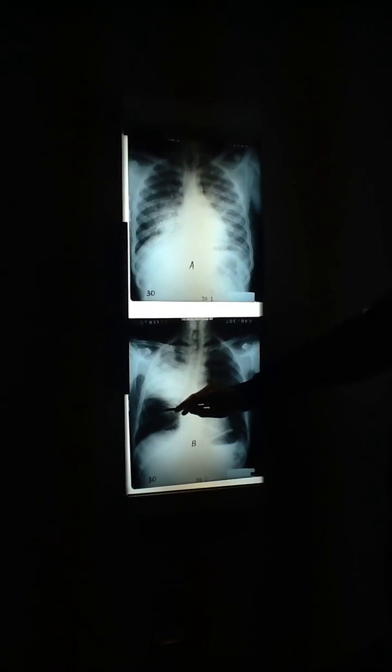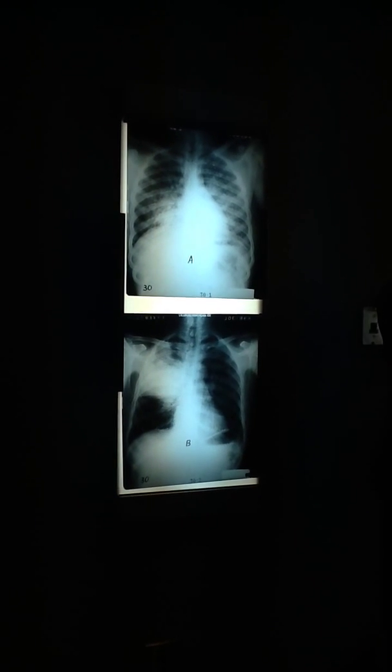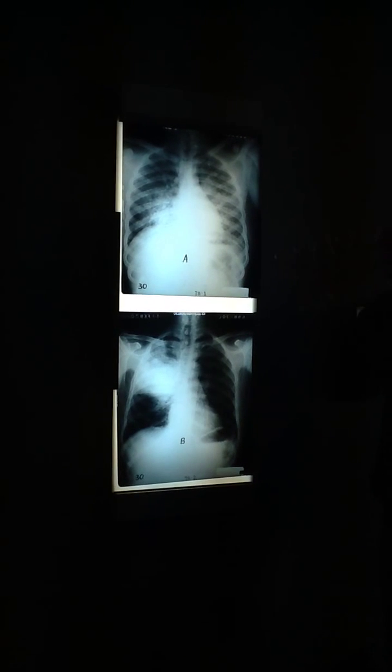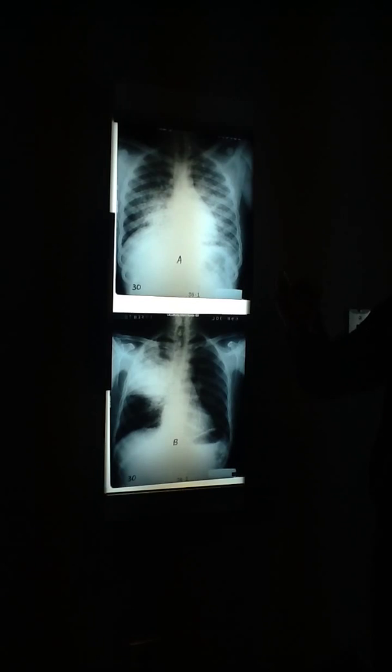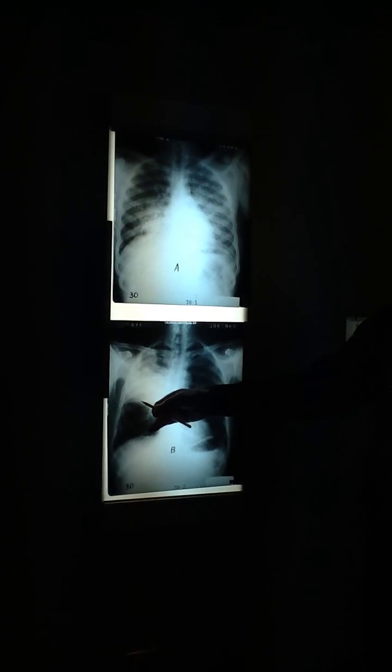All, some, none gives us a fuzzy border, doesn't it? So we have all of them filled up, then only some of them filled up, and then none of them filled up. All, some, none is a fuzzy transition. All, none is a well-defined boundary, and that's what you get up against a fissure.